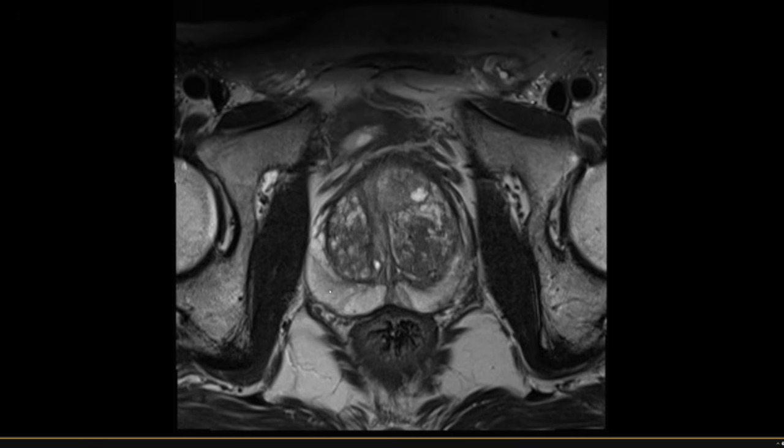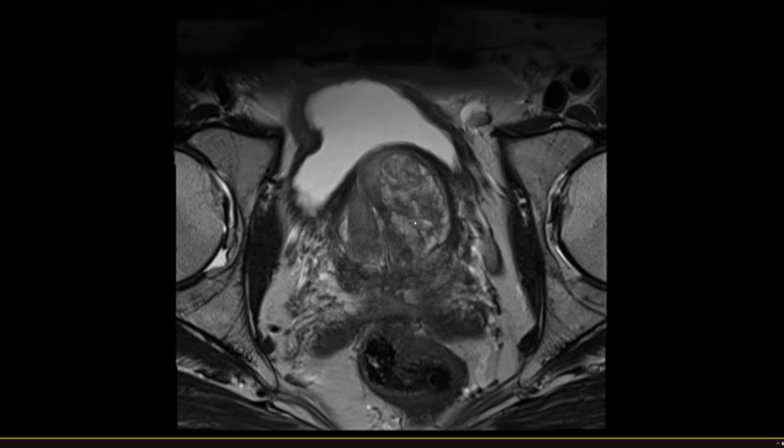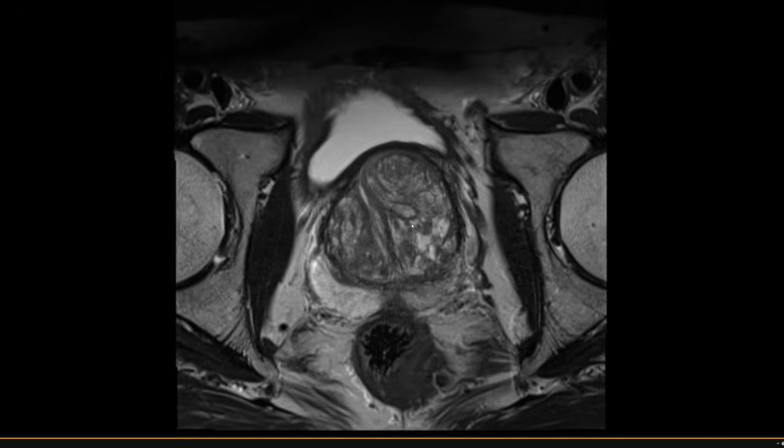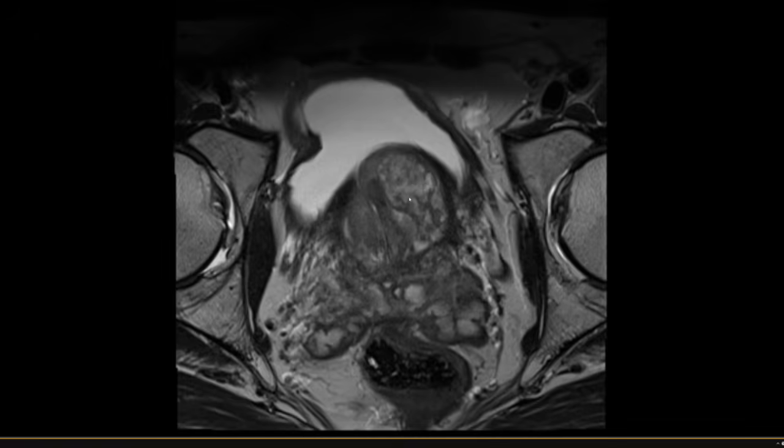So generally, the peripheral zone on T2 weighted images is pretty homogeneously T2 hyperintense, okay? And the vast majority of prostate cancers, about 75%, are going to happen in the PZ or peripheral zone. In the transition zone or TZ, about 25% of the cancers are going to happen here. And so again, the TZ is the site of all of these BPH changes or benign prostatic hyperplasia changes, and we'll talk about what that looks like a little bit more later. So all of these changes here are BPH changes.